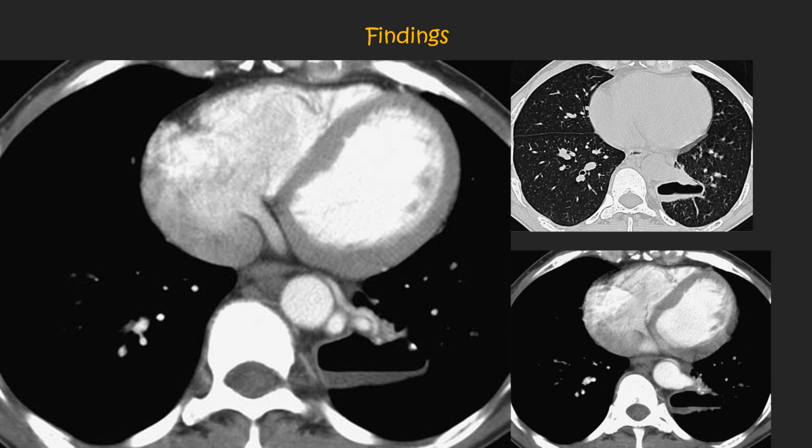Contrast-enhanced thoracic computed tomography. Mediastinal window and lung window images demonstrate a well-defined cavitary lesion in the left lower lobe and an abnormal vessel arising from the lateral aspect of the distal descending thoracic aorta, adjacent to the cavitary lesion. An abnormal vein anterior to the aorta is also present.